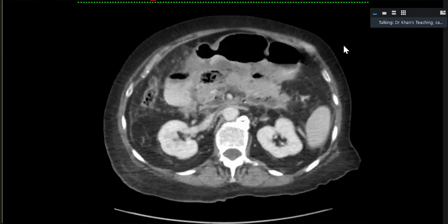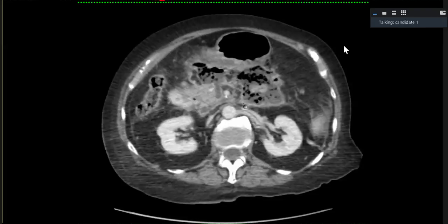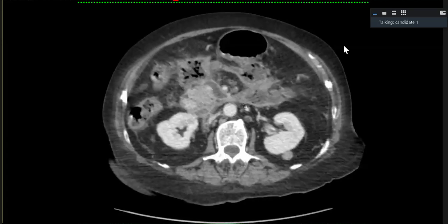There's no history of pancreatitis. So this is maybe an abscess due to, you have mentioned there is a history of neoplastic disease, right? Sorry, I was busy, I have not checked.